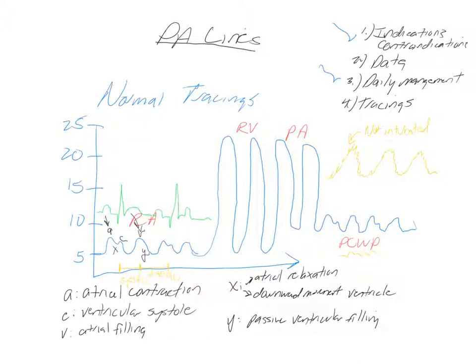That's because the valley is created by the negative intrathoracic pressure that's generated. Conversely, in an intubated patient in which positive pressure is delivered, end exhalation is represented by the valley. So the easiest way to remember is that in a vented patient, you look at the valley to determine the actual pressure measurement.